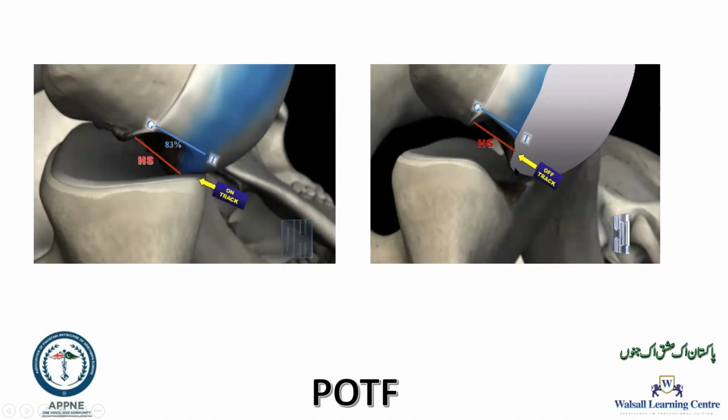If you look at this, the lesion on the humeral side is far bigger, and there's glenoid missing, so it becomes an off-track lesion, which means that it's going to engage. It's going to lock into that defect. So on-track and off-track, remember this. This is a new concept, and I think most examiners will ask the question on which one you want to do, a Latarjet or not.